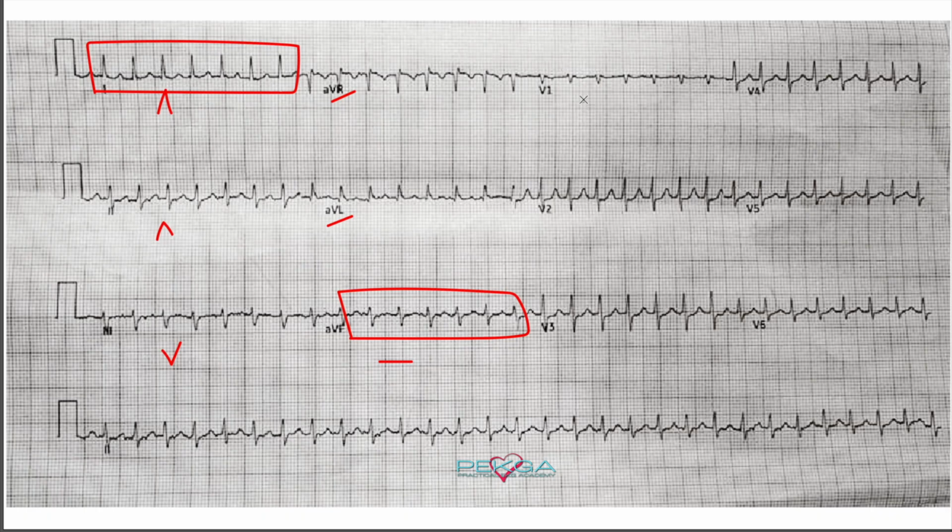There it is. So here, if we take a look at this, we can see that we have a little bit of an R wave before we dip into the major S wave. So the QRS complex is predominantly negative in lead V1, and then boom, it goes into a predominantly positive QRS complex in lead V2.